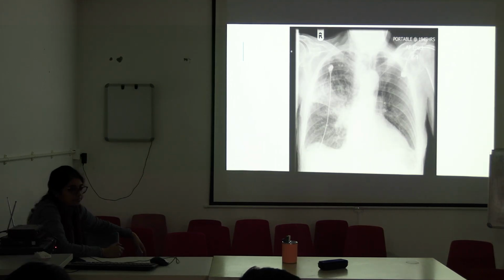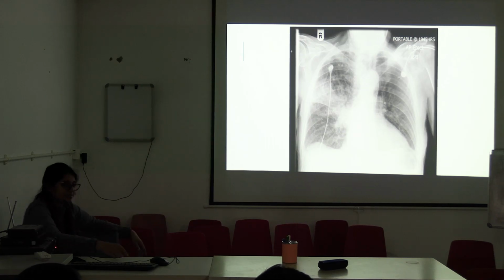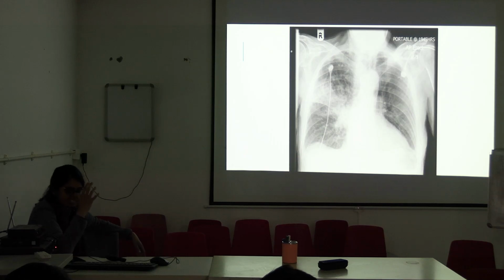Who will describe? We got to go. Describe. Just describe the X-ray. Basic points.